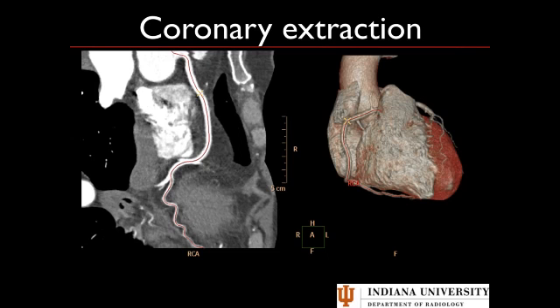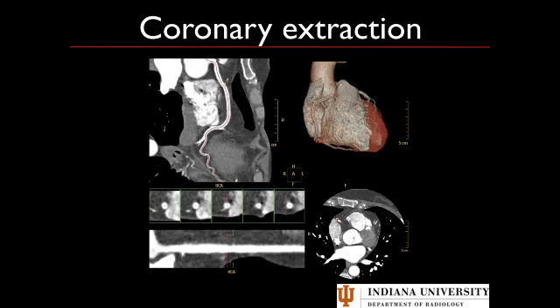This image on your left you'll be able to rotate around and look at from different projections. And then you can actually get this filleted view or vessel view where it lays out and gives you these nice little cross sections.